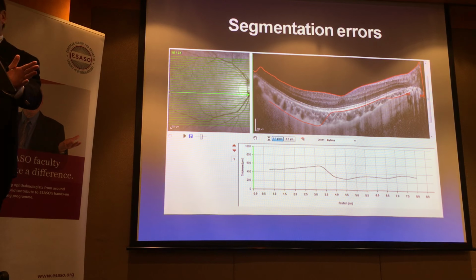It's definitely not going to be as good as a normal eye, but if you want some indication, then that would be one way. Again, in such a setting, I might recommend just taking a few quick line cuts rather than going for the 62 lines.